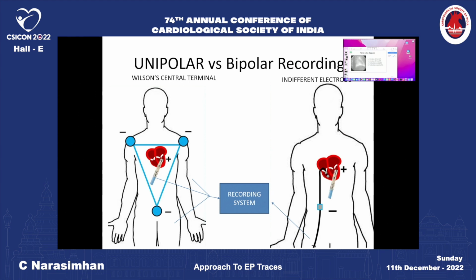So all of you are familiar with looking at the electrocardiogram. Globally, it looks at the wavefront of activation, whether it's from right to left, left to right. So if, for example, inferior wall myocardial infarction, the changes are in the diaphragmatic leads. So the orientation is very similar.